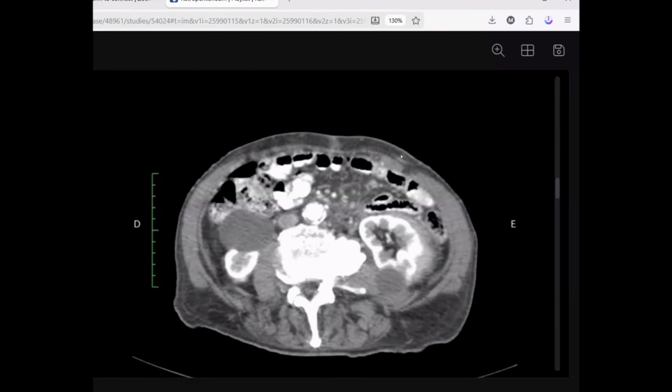Other possibilities could be a mass lesion which is conforming to the contour, not deforming the contour of the kidneys. So lymphoma can present as a single mass or multiple bilateral masses, maybe perinephric soft tissue sheets like this one, maybe also diffuse infiltration of the renal parenchyma. And this is very common in Burkitt lymphoma. Also, sometimes invasion from the retroperitoneal lymph nodes towards the kidneys.